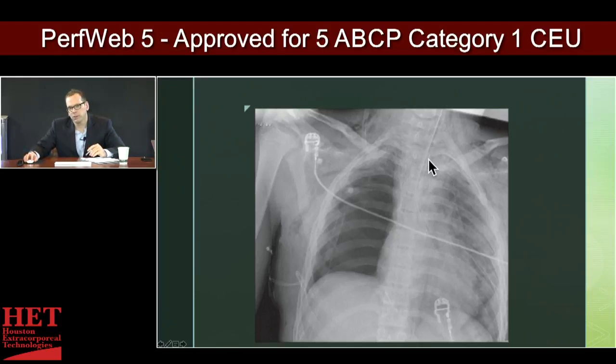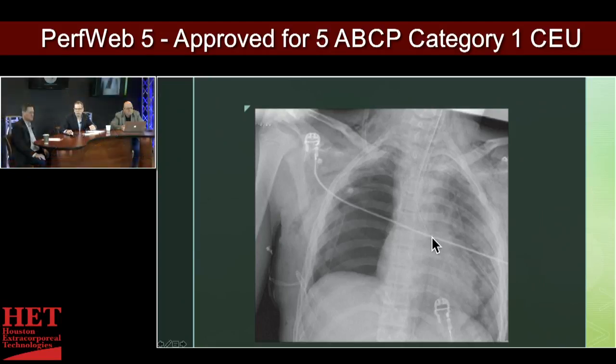But you see the endotracheal tube coming down, and all of a sudden it takes a hard left turn into the left main stem. So this patient is left main stem intubated. That's why you see all of this here, and you don't see any lung markings over here. This is fairly dark and therefore full of air, with no lung markings whatsoever. So this patient has a pneumothorax on this side. This is a chest tube coming in here, but this lung will never re-expand until anesthesia gets the endotracheal tube out of the left main stem and starts oxygenating the right side.